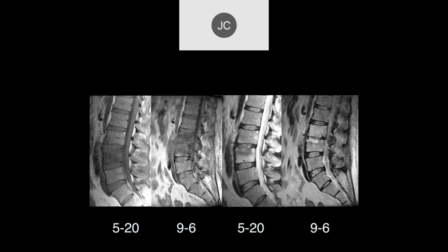Okay, on the T1 images, we see similar irregularity in that L4, but now it's involving the L3 vertebral body and that intervertebral disc. And again, notice how you've just lost the visualization of that subchondral bone of the end plates. And on the T2, you can see that this disc is now involved. It's decreased in height. We can see some edema within that superior end plate.